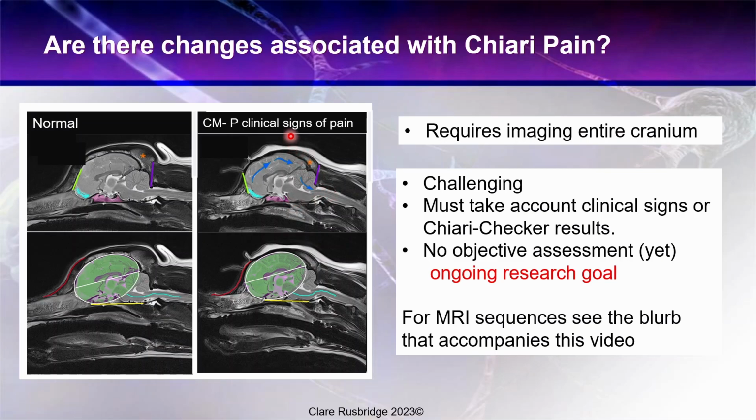With the screening procedures they'll often just get one entire grab, so as much of the cervical spinal cord as they can get in, and as much of the brain, and especially in low field MRI scanners, they only have a small field of view, so you're only going to get about 14 centimetres of dog in that one view. A bit different for the high field scanners.